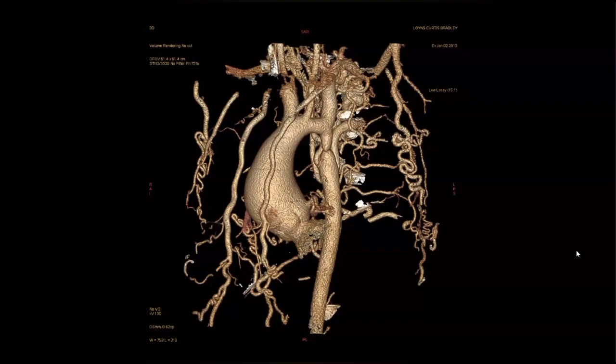There's one thing that you need to see to clinch the diagnosis. Let me help you. What if this patient has a bicuspid aortic valve?